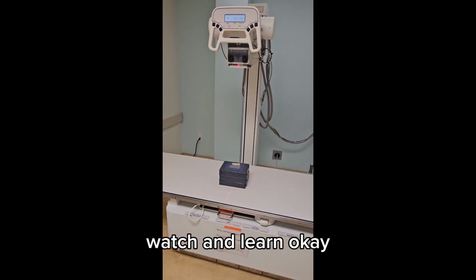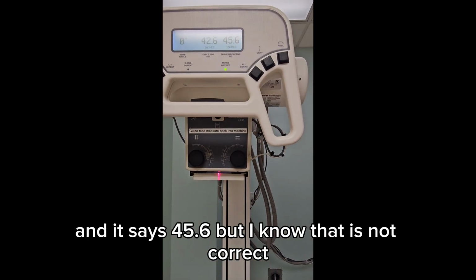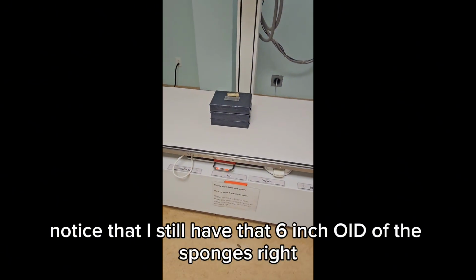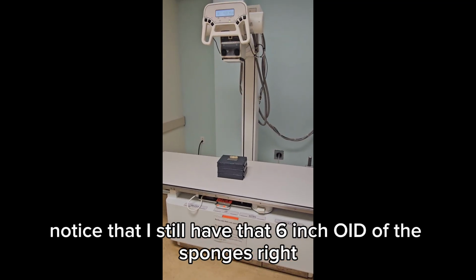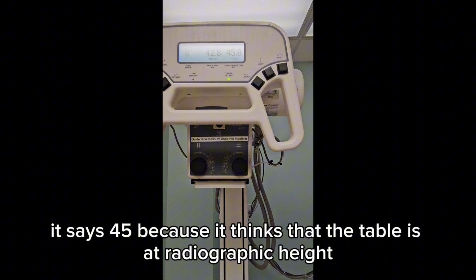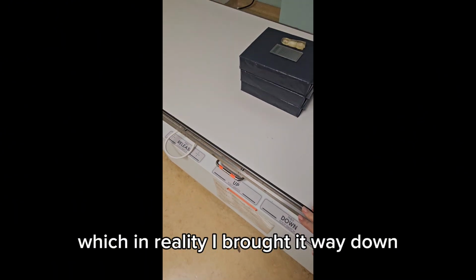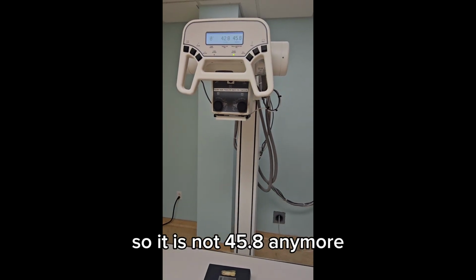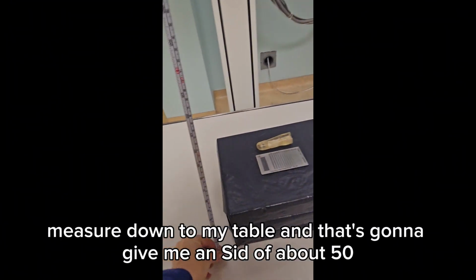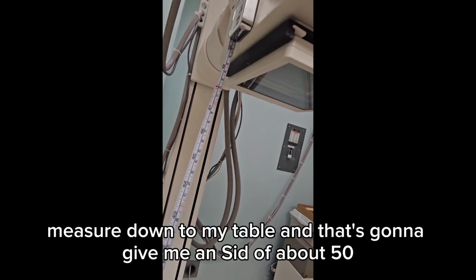Watch and learn. Okay. So now I've brought my tube up as high as it goes, and it says 45.6, but I know that is not correct because I also brought the table as low as it goes. Notice that I still have that 6-inch OID of the sponges, right? But there's no way it's 45. It says 45 because it thinks that the table is at radiographic height, which in reality I brought way down, so it is not 45.8 anymore. So what I need to do is take the tape measure, measure down to my table, and that's going to give me an SID of about 50. Okay.